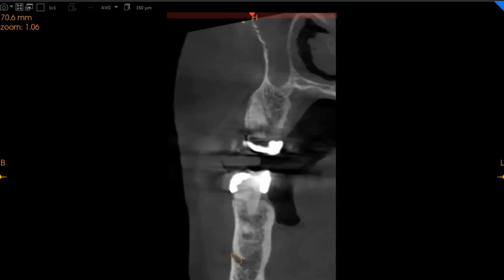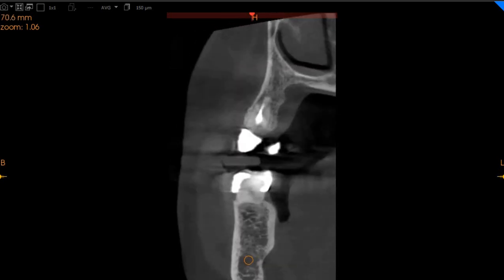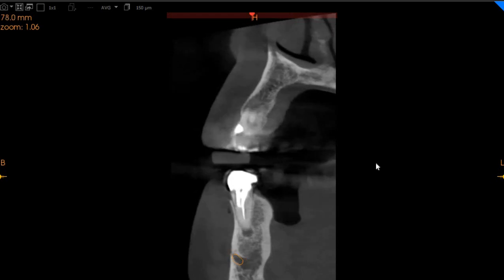Moving to the lower right segment, we can see that we've got endodontic treatment done in the lower right second premolar, and that is also leading to a significant periapical radiolucency in the lower right second premolar. We can also see poor obturation and a close to perforation, or strip perforation, in the obturation as well.